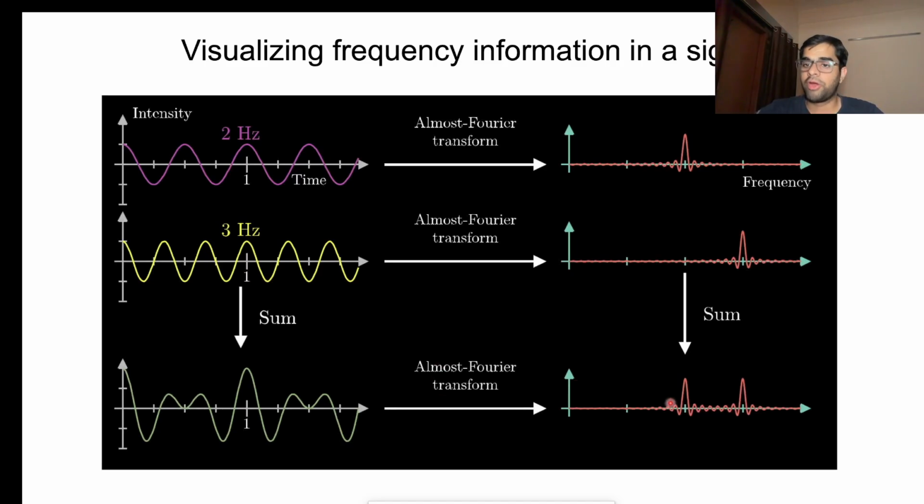So whenever you do a Fourier transform and plot, you see a high value in the theta band. So in order to know which kind of oscillations is there in a given signal, we do that. These are the two things for which we are going to the Fourier frequency domain right now.